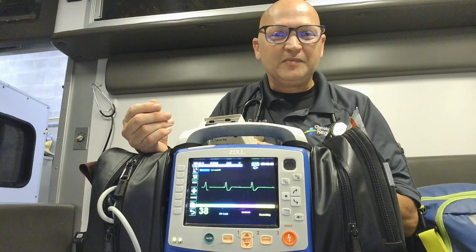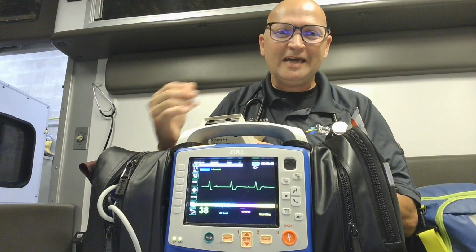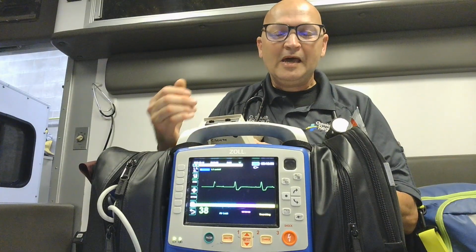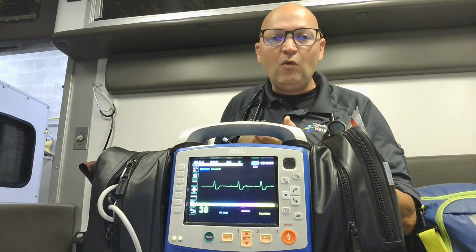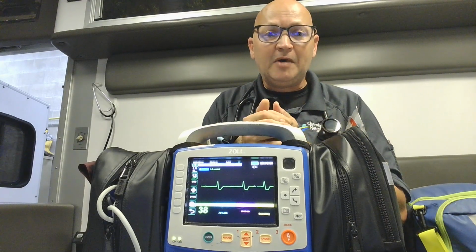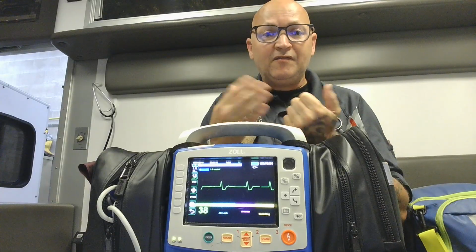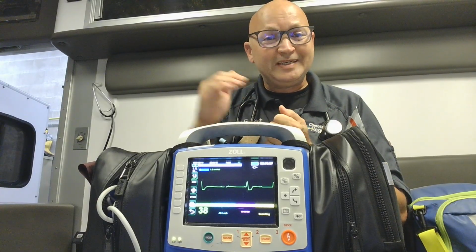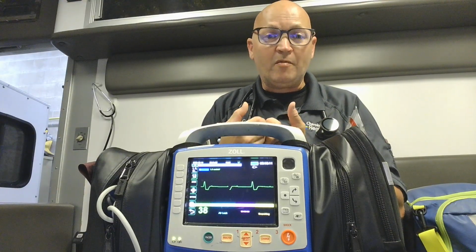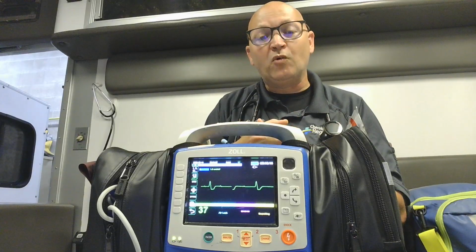I hope this was a little bit informational for you. I know it's a lot to take in because you may not understand EKGs yet, but at least you got to see a few of them and see why they're so important, because they tell us a whole lot about what's going on in the heart. Not only the electrical activity, but also a little about your electrolytes. We can also see if a patient is having a heart attack. ST elevation is indicative of actual heart muscle damage, and we see this in a heart attack. I'll go over that more later on.